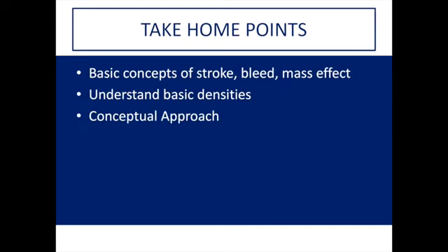3, use the conceptual approach. If you're working in the ER, especially in the community, looking at the brain a few times isn't enough. Make it a point to go look for the big things that we just discussed. Start with mass effect, look for the sulcal effacement, look at the suprasellar cistern, look for midline shift, and look for tonsillar herniation. Look for blood specifically using blood window, and then use a stroke window to rule out strokes.